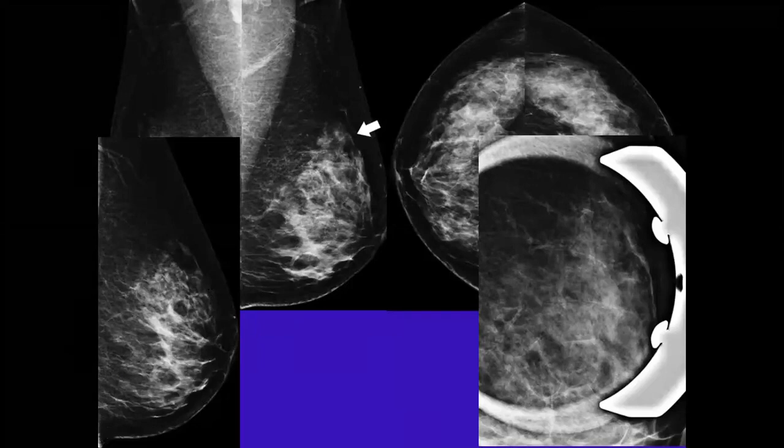It is a true lateral, straight lateral, 90-degree lateral. So is it seen here, the opacity, this added density, or the asymmetry? Is it visualized here? Or is it spreading or different? Is it well shown here? No, it is spreading now. It's spreading, and here on the spot magnification film, it's also spreading. Spot compression also is spreading away.